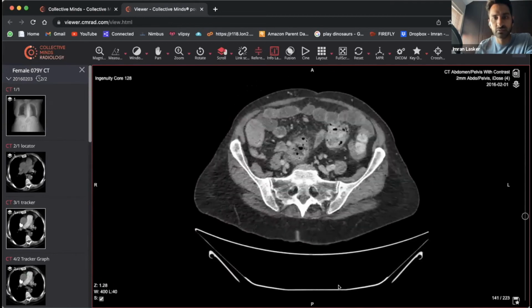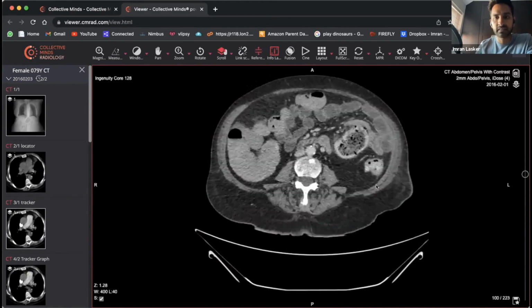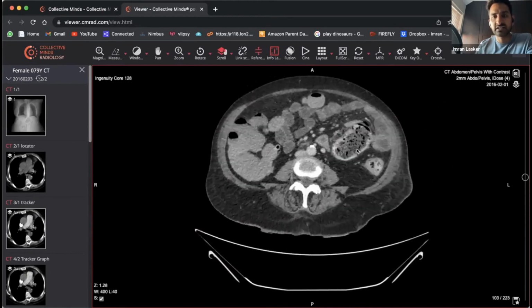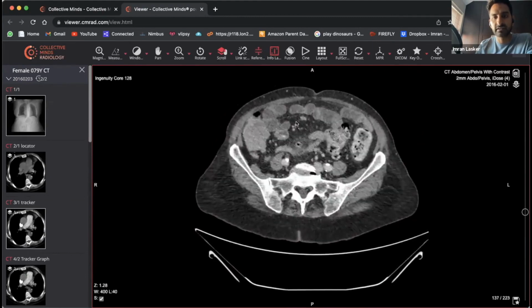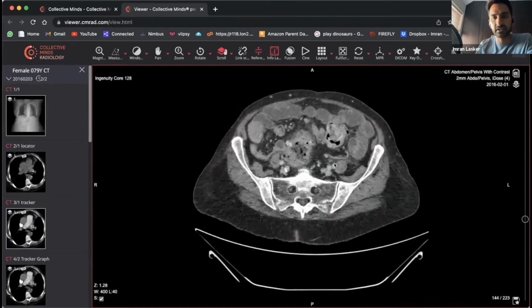In the small bowel, if we do one cursory look through it, the small bowel looks okay as well. So as you scroll through now, hopefully you can see that there is a difference around the fat. The fat all looks okay. Get to here, it looks very, very hazy. So if I'm saying it's not diverticulitis, then what could it be?